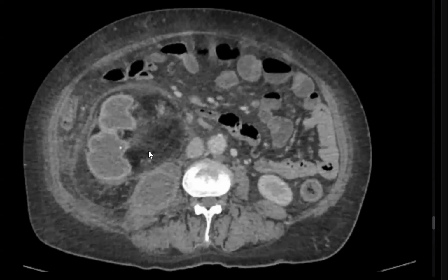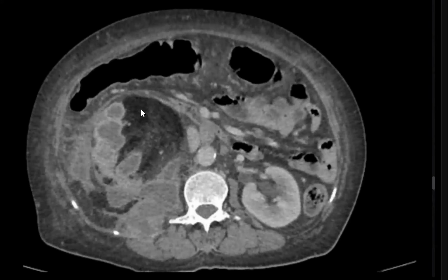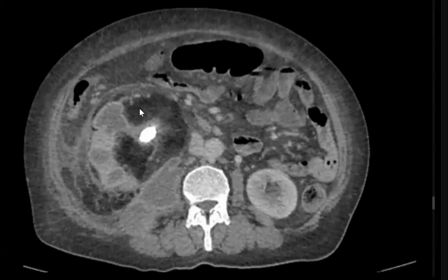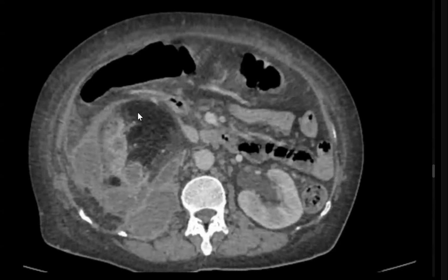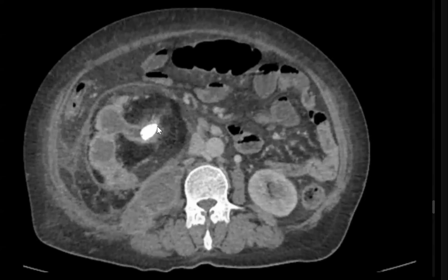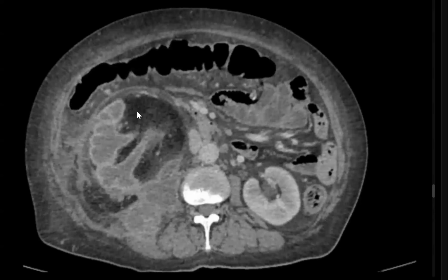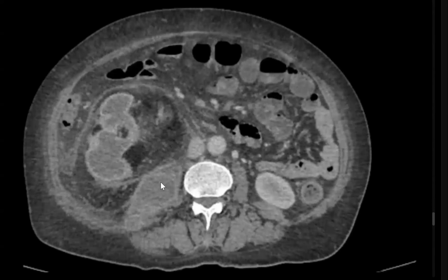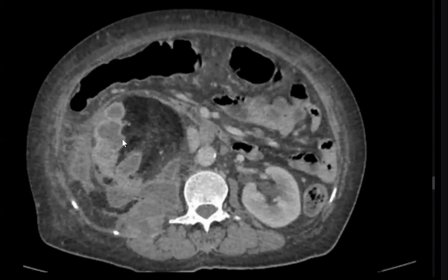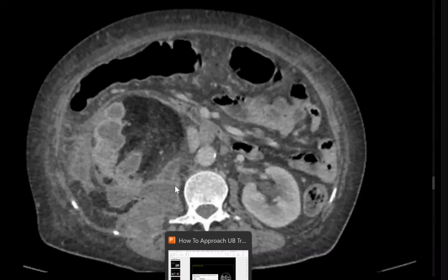You see, my friends, this is the nature of the name, xantho. It's lipid proliferation or infiltration of the renal sinus, especially, and sometimes renal parenchyma. This is a fat infiltration. It's a typical case also. We have also here an abscess, a perinephric abscess and psoas abscess, the same as the previous case. Good, my friend.